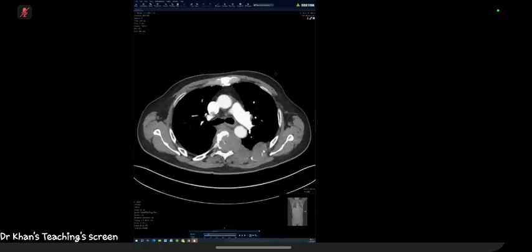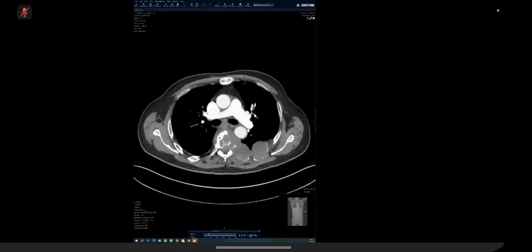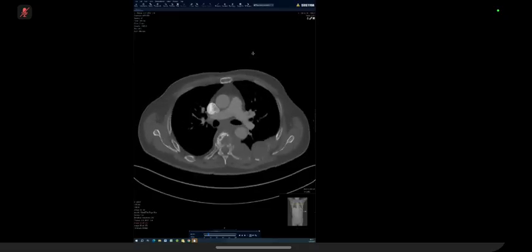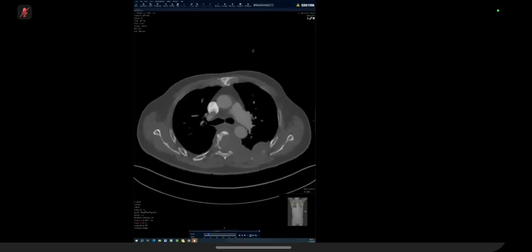Anything else to make sure the patient is walking next week? Oh yes, I'll check the bones and check the spine. So I'd look at the sagittal imaging as well. And also here I can see that the spinal cord is involved with the soft tissue mass, and there's an invasion of the thecal sac, and complete soft tissue opacification of where I would expect the spinal cord to be.